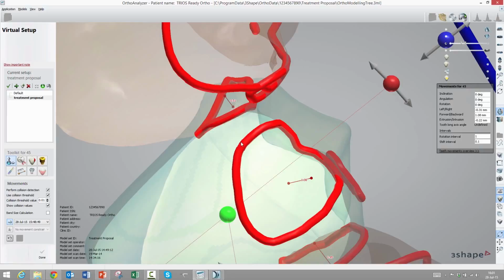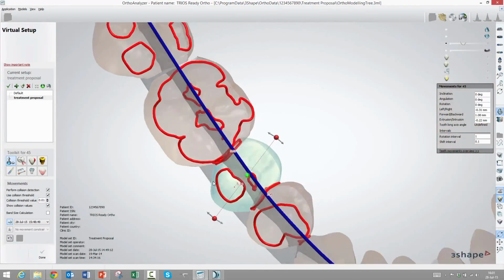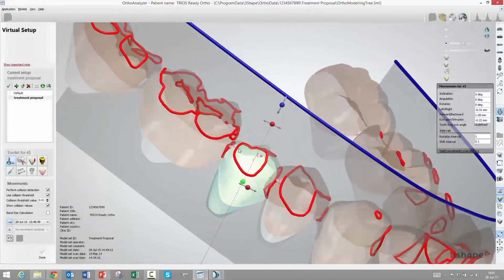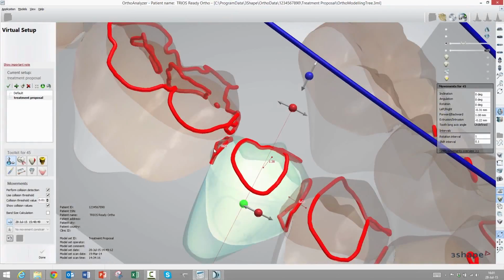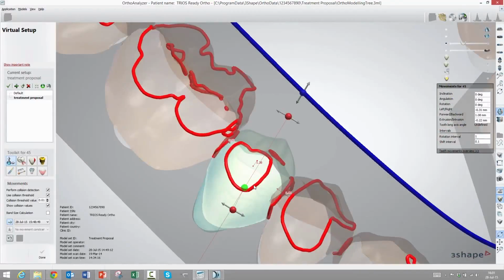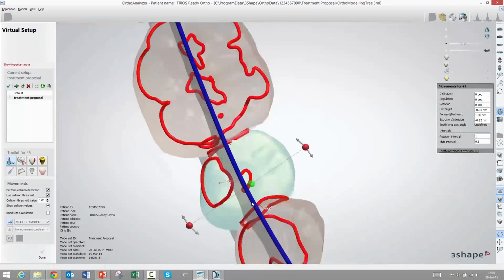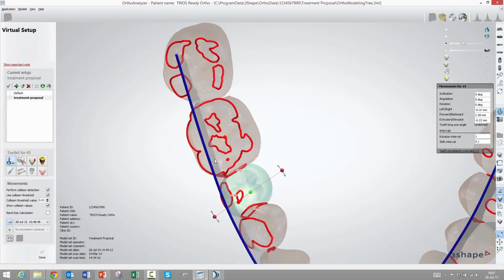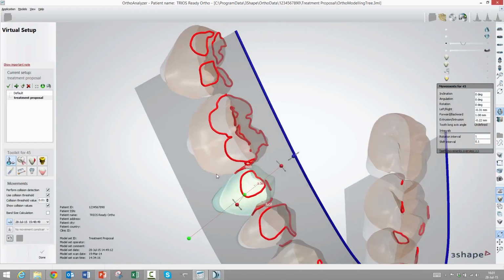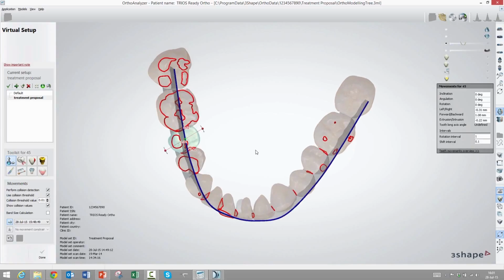This is simply because we cannot compute collisions between two objects that are not very geometrical without having this indication. It's very hard otherwise to show the user where this measure was taken, because it can change a lot. But this is really taking the maximum intersection between these two objects that happen to be teeth. So that's the collision detection tool and the way you can use it.